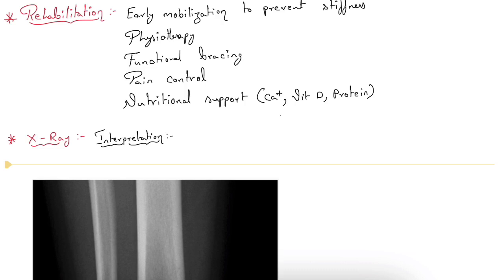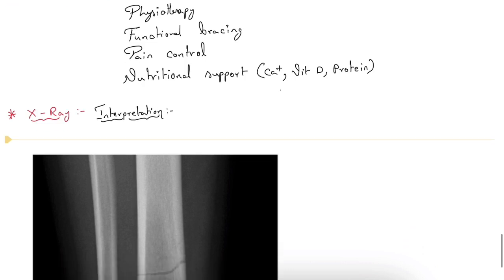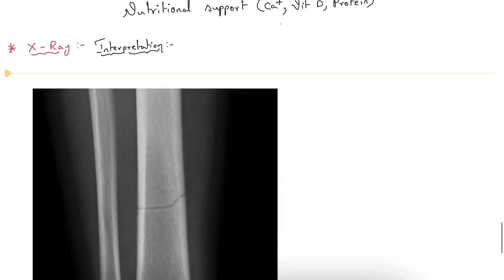Now this is the main part. X-ray. How can we interpret the X-ray? Okay, the last X-ray I will give you, so you have to see that X-ray and mention in the comment section how you can interpret that.